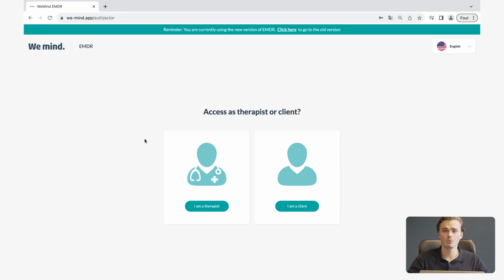Welcome everybody. Today we're going to introduce to you all our brand new and rebuilt WeMind software. We've completely changed the design to make it even more user-friendly and to help you get more and more out of your EMDR session. The basic features are the same, but we improved it a lot and completely changed the design.